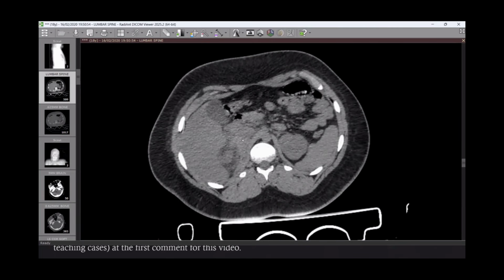You told me it is in the hepatorenal. Is it in the hepatorenal? It's localized in the adrenal gland. Retroperitoneal, correct? Yes, in the right adrenal. So this is at the site of the right adrenal gland, maybe adrenal hematoma. You are right, maybe adrenal gland injury.